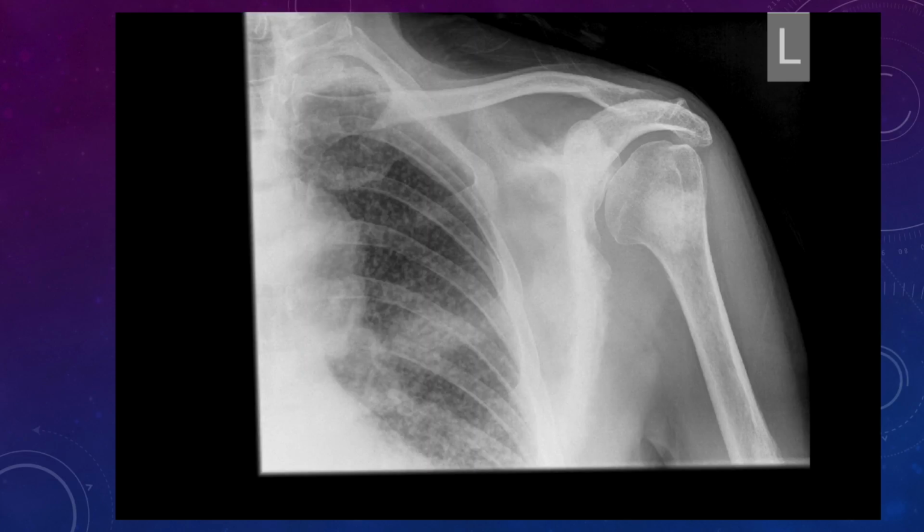Okay, how about this one? Shoulder film. Shoulder pain. If this one came on your pile for reporting, presumably you'll be F5ing out of that and going to the next one. Or maybe thinking, go on, I'll have a go. I'll go and find a nice friendly radiologist or somebody to give me a help. What are the features? What are we looking at here? There's a lot going on. And this was how this patient presented with shoulder pain.